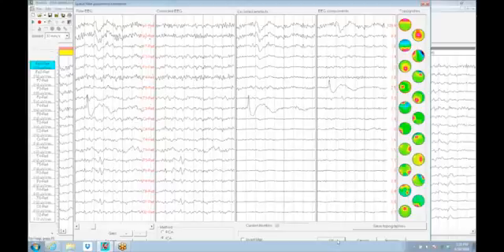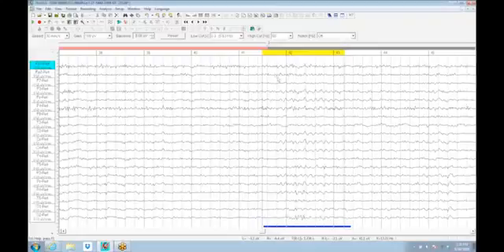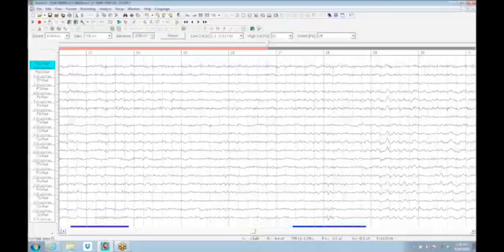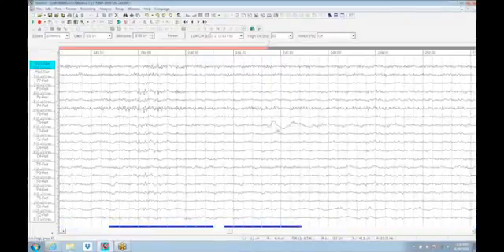Now, if I click OK, we can go back into the EEG, and we can see this piece of EEG that we would have thrown out here is perfectly nice. We didn't really need to throw away this bath water here to get rid of that eye blink baby. And like a lot of these, there will be some as we go through here that we probably are going to want to fine-tune to get rid of this T3, bigger slow wave bump.